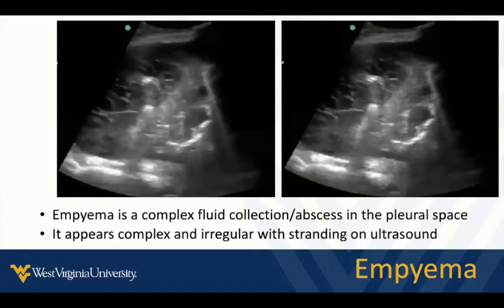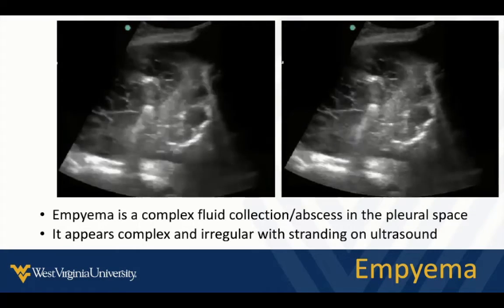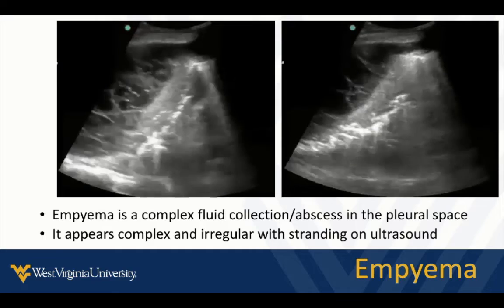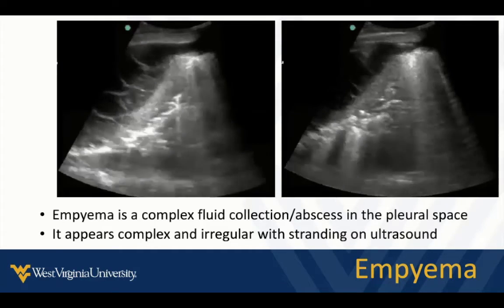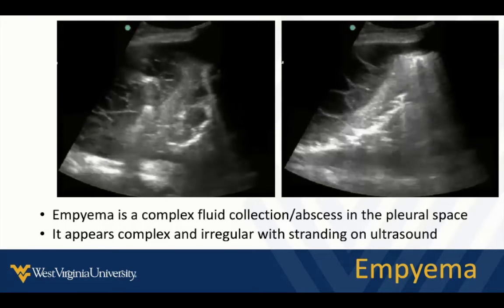The treatment for these is going to vary depending on how severe it is and what your scenario is. Ultrasound is definitely the best way to identify and characterize empyema. Even on CT, the contrast resolution is usually suboptimal to fully characterize empyema in the chest.